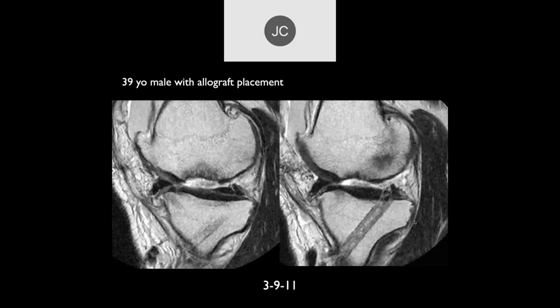And this just shows further degeneration and tearing of this allograft. It's hard to get the grafts of proper size. That's one of the big problems. And here's a technique where you can see the anterior horn. Now this is the graft, and this is the native periphery of the posterior horn. You can see where the tunnel to stabilize the graft is more anterior here, but the native periphery of the posterior horn is back here. This also makes it more complicated because you need a smaller graft if you're going to preserve a portion of the posterior horn of the native meniscus.